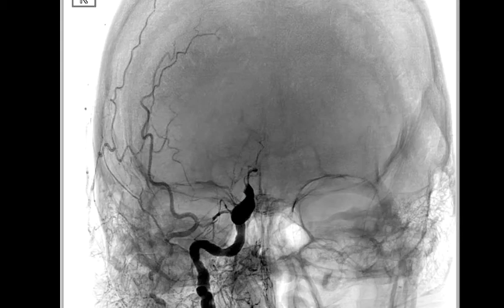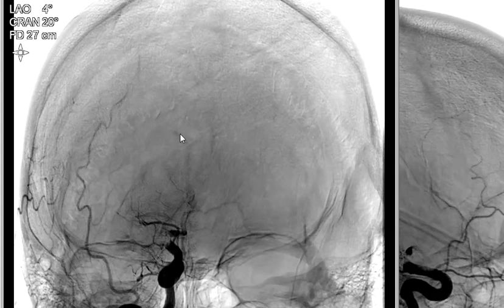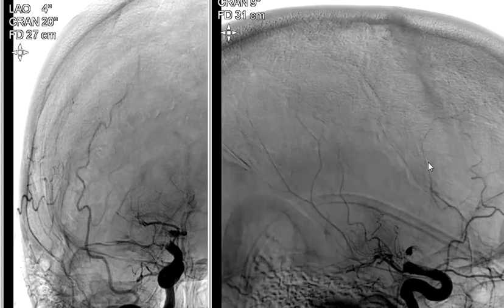So eventually, this is the final result. It still didn't really open up, and here is the result. But at least no hemorrhagic transformation, and the patient is in physical therapy right now. After 2 weeks, still did not pass away. So what I'm trying to say is, despite aggressive intervention, some blood clots are hard to retrieve or remove.